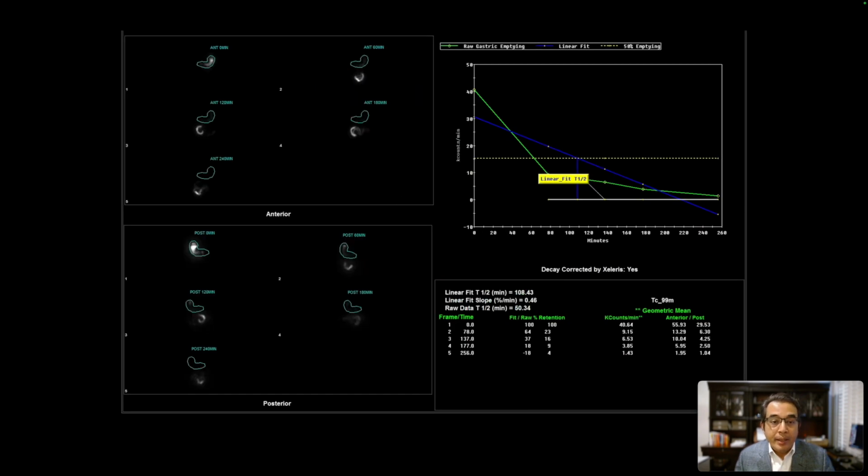They underwent a gastric emptying study, and on these images, we find anterior and posterior spot views at different time points after they had ingested a standardized meal. Here's the first image labeled 0 minutes, and here's the second image labeled 60 minutes. So we can see that most of the stomach has emptied before an hour. So this patient probably has accelerated gastric emptying.